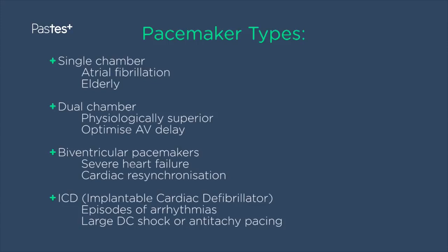This is a process whereby the ventricle paces faster than the underlying ventricular tachycardia rhythm, thereby taking over the electrical conduction of the heart, and then all of a sudden stops. When it stops, it hopes to get a capture beat and restore the heart back to normal sinus rhythm.